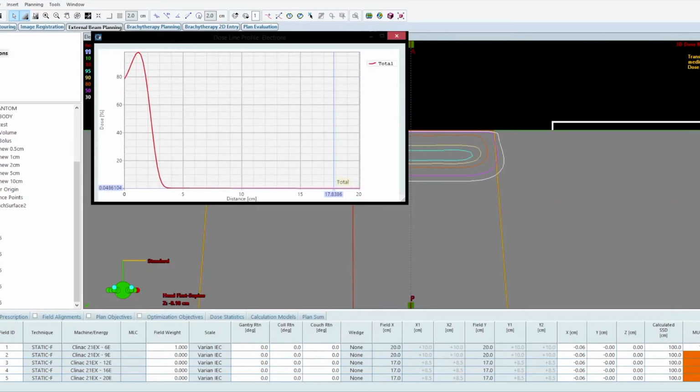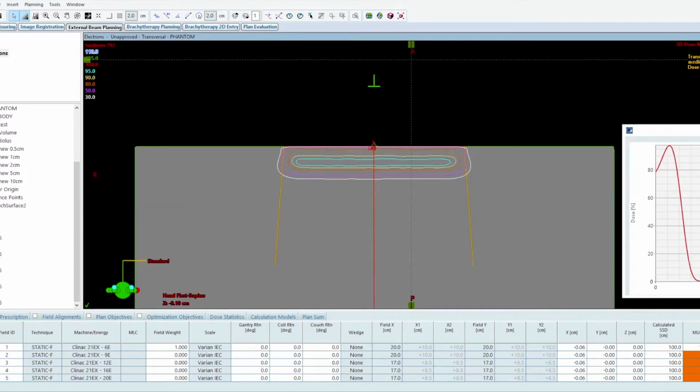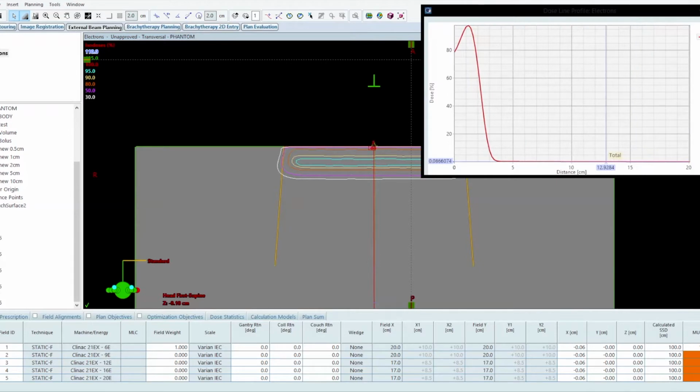If we look at isodose lines, once I start showing you other electron energies, you'll see what happens to these isodose lines, but you have a very rapid falloff. There's a very small clinical range of treatment for 6E, which is why it's not used for much other than superficial skin cancers with maybe a half centimeter of bolus. The falloff is just too fast. The risk of using 6E clinically is that you might miss the posterior edge of the tumor.